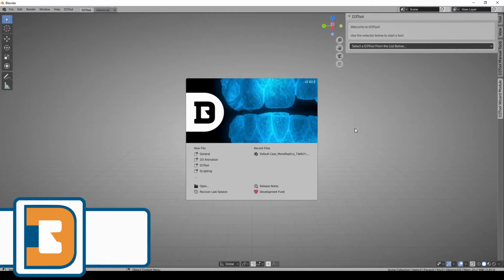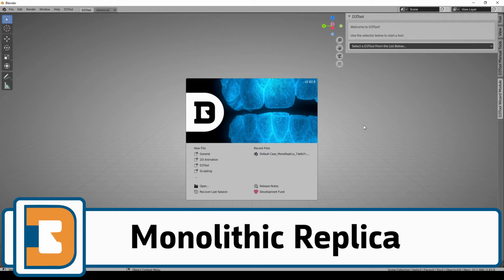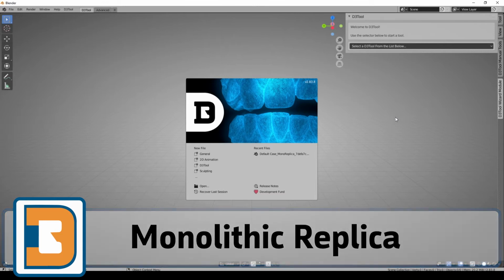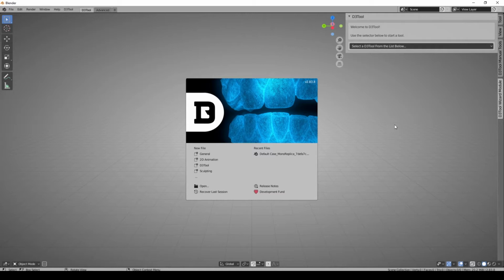In this video, we're going to walk through the steps of the Monolithic Replica workflow within D3Denture. This is an extremely powerful and necessary component of the total digital denture workflow. However, its purpose can sometimes be intuitively difficult to understand upfront.